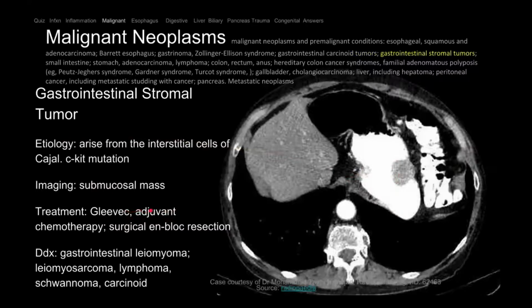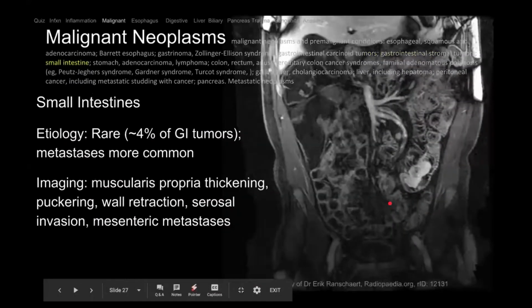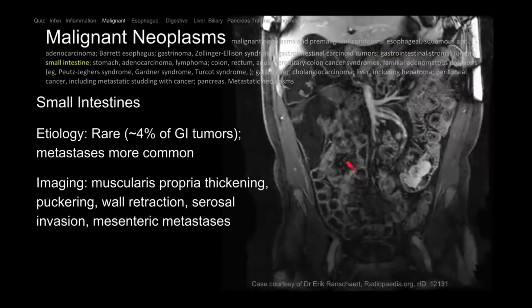And so it shrinks it down, and then it can be resected depending on how big it is. So this is GIST, typical presentation. In contrast to GIST, here is an MRI. We see this contrast enhanced. So the mesenteric vessels, the SMA, SMV, they're bright. So it's the liver. And you can see on the MRI, we can look at the bowel really beautifully, right?